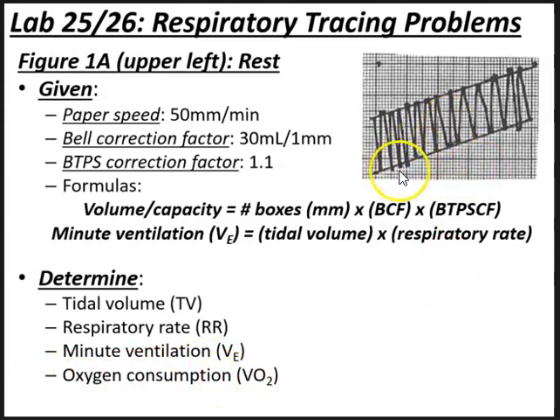So we can see, again, the slope is going up, meaning the body is using oxygen in the bell, and then replacing it with carbon dioxide. Now, within the apparatus, the bell has soda lime crystals, which will remove the carbon dioxide and make it lose volume. So as the volume goes down, the bell writes higher, meaning the volume is going down, and this slope goes up, okay?